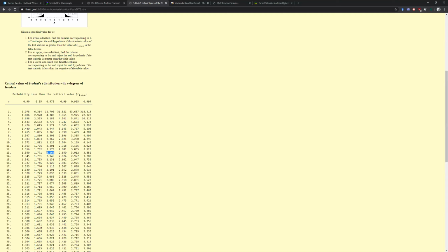And so a little more strict, because what we're really running are 2 one-tailed t-tests. And so in this case, we can kind of remember these numbers. We'll come back over here and pull them back in when we're looking at the results.